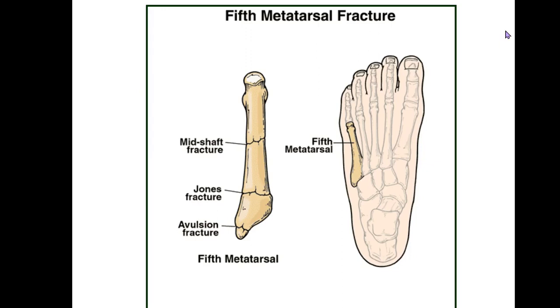Okay, there are several fractures that can affect the fifth metatarsal. So patients can have a basic fracture of the mid-shaft that you see here, and that could be from a fall or some type of injury. But I'd like to introduce you to a Jones fracture. A Jones fracture is a fracture of the fifth metatarsal near the base.